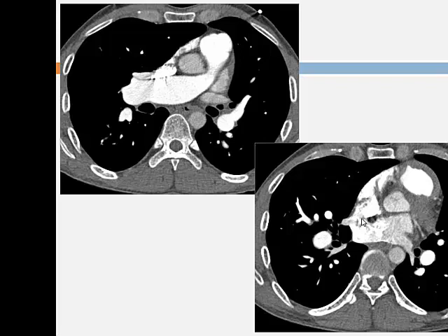So easy peasy, if you're ever faced with a dilated right heart on CT, on MR, on echo even, you have to think about four things. This is irrespective of things like thromboembolic disease, lung disease, left heart disease, okay? So you think about, what, ASD? What type of ASDs are there?